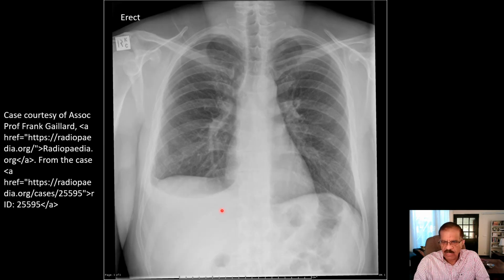Now this is another effusion, and this is not lateral decubitus. This is an erect film. The patient is standing, but you can see that this effusion is called lamellar. This is lamella. This effusion rises like this in a band-shaped pattern against the chest wall, not occupying the most dependent part. This is called lamellar pleural effusion. The etiology, the differential diagnosis, and the treatment plan will be the same, but you need to familiarize yourself with this look of pleural effusion also. Lamellar pleural effusion.